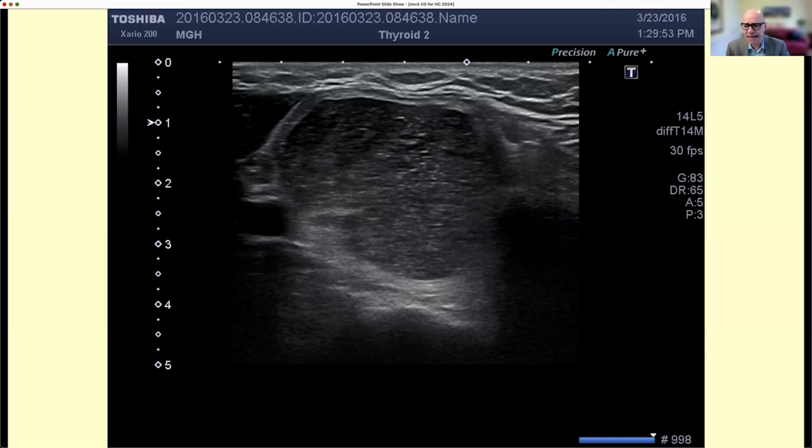Occasionally, I've seen isoechoic nodules that turned out to be lymphomas. But there isn't a specific ultrasound pattern that will make you suspicious of a lymphoma necessarily. I do not see cystic spaces in lymphoma, and these are microcystic spaces, so I don't think this is likely to be a lymphoma. It's usually very homogeneous, no matter what the texture ends up being.